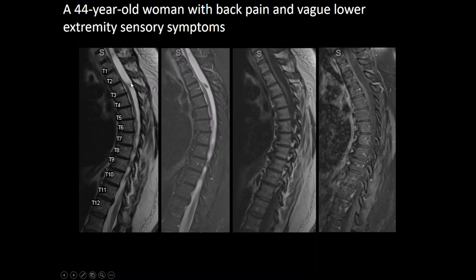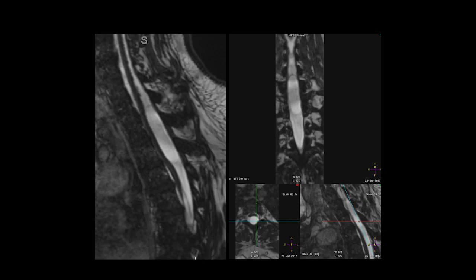It widens the subarachnoid space both superior to and inferior to the lesion, and therefore should be placed in the intradural extramedullary compartment. When you look at this particular lesion using high-resolution T2 or CISS images, you can see a thin membrane along the superior and inferior aspect of this lesion.